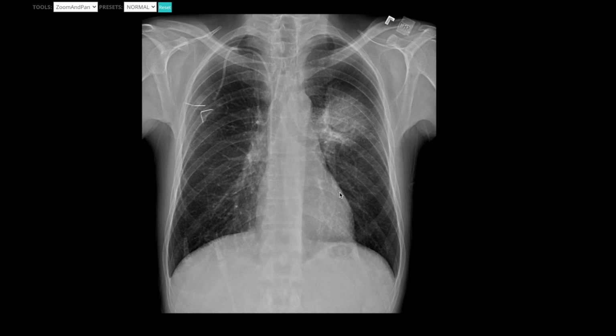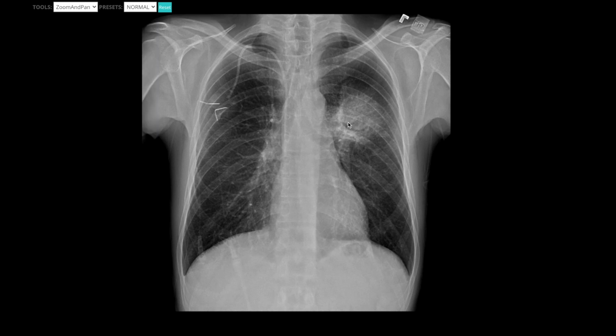When you've looked at enough, you'll realize how insensitive or not specific a chest x-ray is, because this is a slam dunk pulmonary edema, this is a slam dunk whatever it may be, and you pull up the CT and, no, it's actually not at all. It's perfectly normal. So, use everything with a grain of salt, but in this situation, it's a clear left upper lung zone pneumonia, this kind of dense focal opacification.